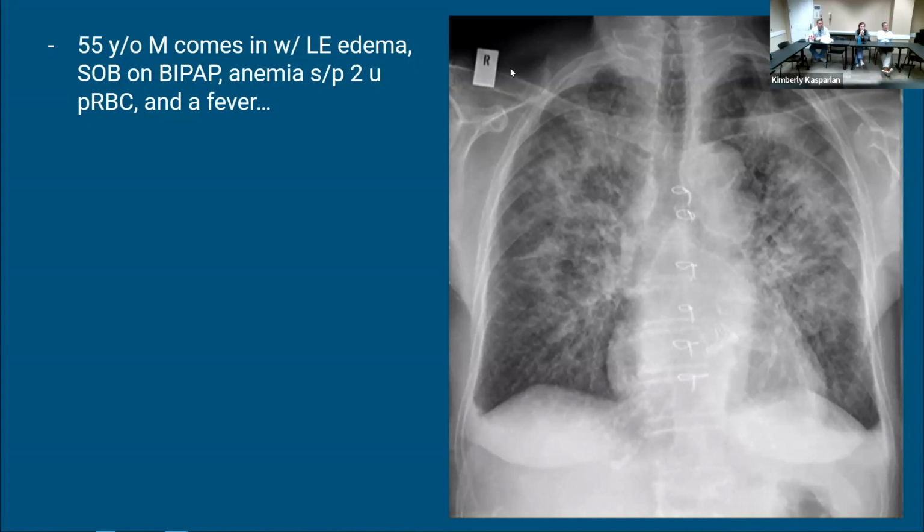So before differential, how would you describe both of these lung fields? How would you relay that verbally for the picture? Like you're calling me, medical, and I'm asking what did the chest X-ray show? And you want to describe that picture. That's the thing, not so very professional.